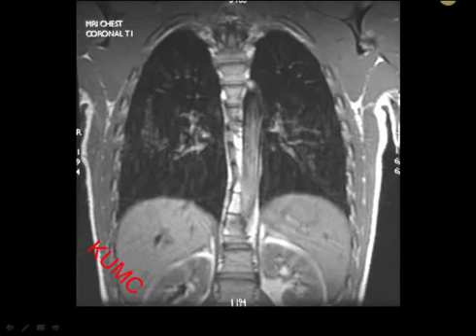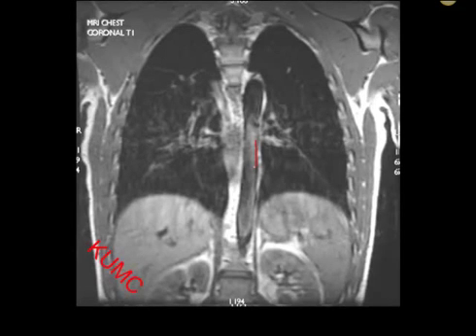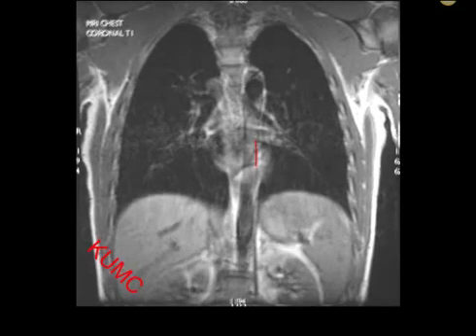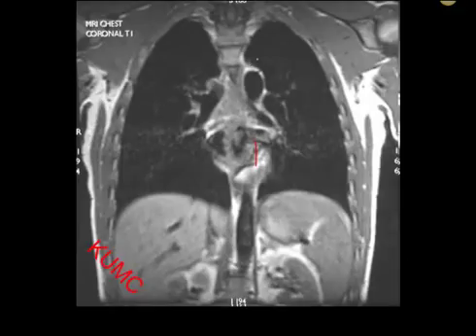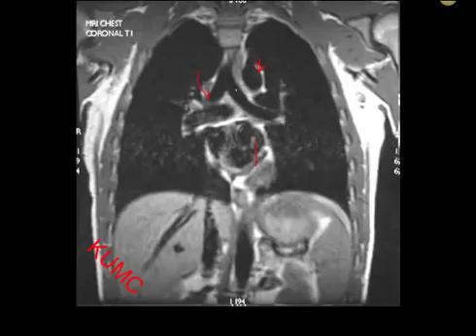In the back is the descending aorta. And what we're doing is we're going from posterior to anterior. So notice what's happening here. There is the aorta. In fact, there's the aortic knob that you can identify on a chest x-ray. We are also at the same time looking at portions way back in here of bronchi. Now, with this particular MRI, air and moving blood are showing up the same. So there is the carina, for example, in the left main stem bronchi. At the same time, pulmonary arteries. Remember, all this stuff is going towards the hilum of the lungs. And we're getting into the left atrium.